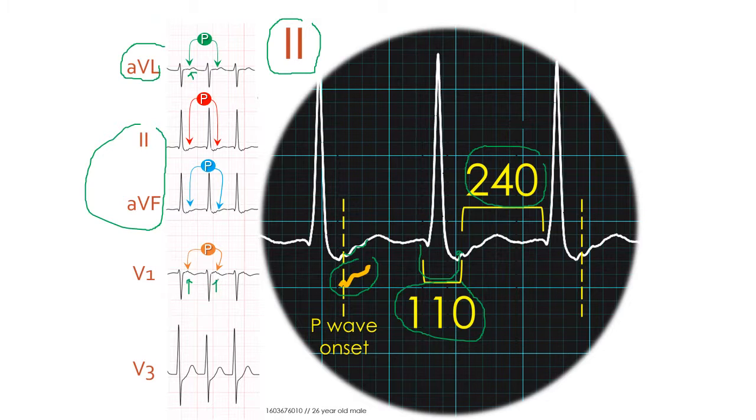This pattern is compatible with an atrioventricular reentry tachycardia using an accessory pathway, and because the P waves are negative in lead aVL, we anticipate a left free wall accessory pathway. As indicated before, in lead V3, we see clearly the presence of QRS alternance, and this is also suggestive for an atrioventricular reentry tachycardia using an accessory pathway.